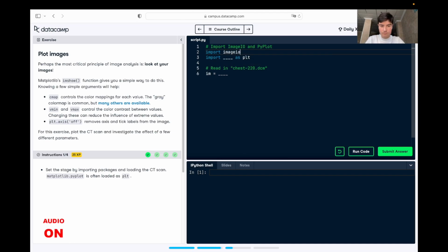Pyplot is a module in the Python Matplotlib library that provides an interface for creating graphs and data visualizations. It's commonly imported as plt in most programs. It's an essential tool because it provides a wide variety of methods for creating different types of graphs, such as line graphs, bar graphs, or histograms.